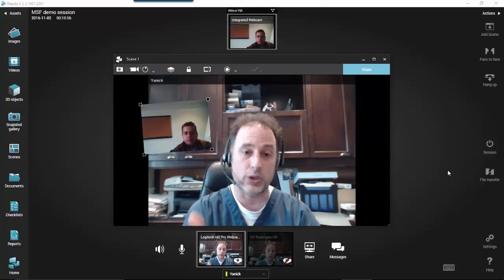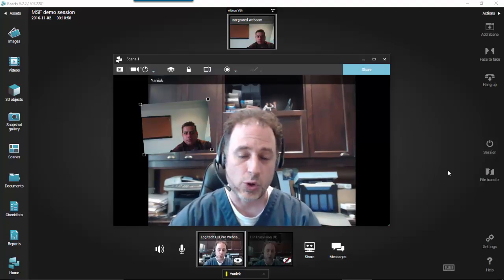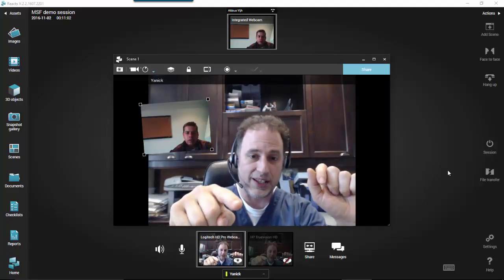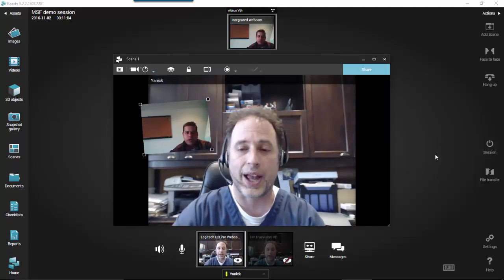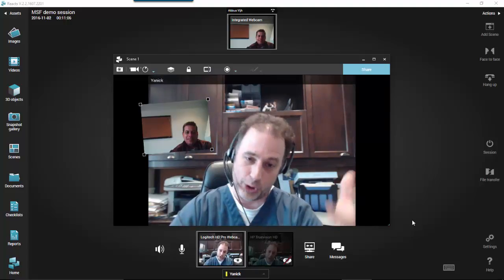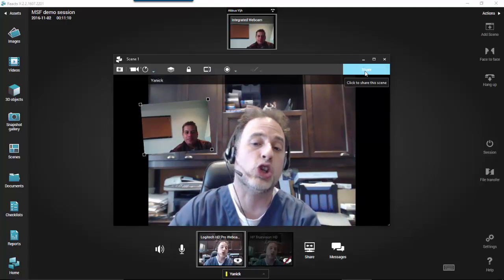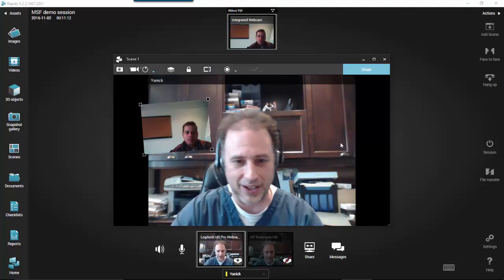So Al, if you click on your video feed, so I'm doing nothing here, my hands are here. So Al can click on his own video feed. Oh, share, sorry, I'm not sharing, sorry. Good point, Al. So here, you see there's a big blue button. It's written share. And I even forgot myself.